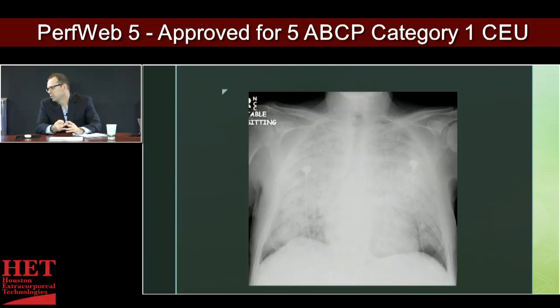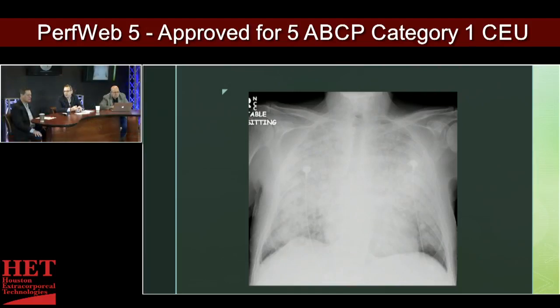Then the lung fields, which you described, you have this big fluffy cloud pattern on both sides involving all the lung fields, which means this is a process involving all of the lungs. So you would not think in this setting this patient has a massive pulmonary embolus, something along those lines. You would think that this is more of an interstitial or a lung parenchyma problem. And then so your differential diagnosis is going to be pneumonias, aspirations, ARDS, could it be COPD, those sorts of things.